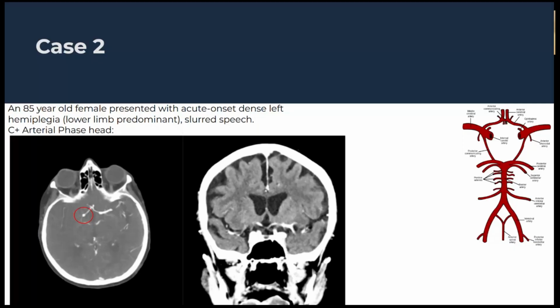It looks like the blood flow stops, so it's called a hyperdense artery sign, and it's in the right middle cerebral artery. So that's a middle cerebral artery infarct, and you can see the darkening of the grey matter on the outside in the other scans. So it's the MCA that's been occluded. That's caused the infarct in the brain and the tissues that the MCA supplies.